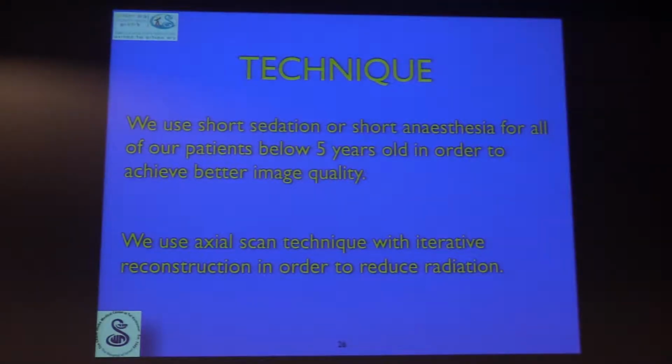Before scanning, we use short sedation or short anesthesia for all of our patients below 5 years old in order to achieve better image quality. We use an axial scan technique with iterative reconstruction in order to reduce radiation.